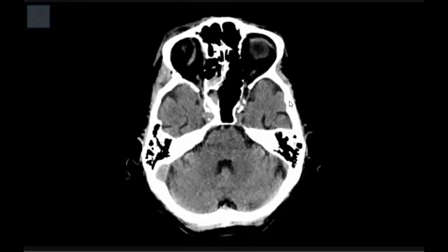What is this? Superior ophthalmic vein. What's happening? Prominent superior ophthalmic vein with the cavernous sinus. What are you suspecting? Carotid cavernous fistula. What will you do next? MRI to see the carotid cavernous fistula and confirm the diagnosis. Is this patient on the table? I will give contrast.